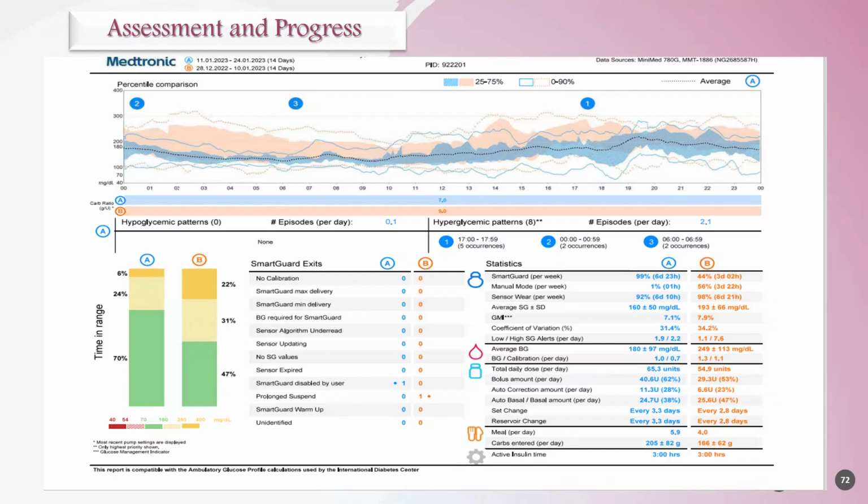It's a full report containing four parts. These four parts are very crucial and a very good starting point. They can give you all the details which you need. And later on, if you go to the other reports, they just support the features which you see here and give more details as you want.